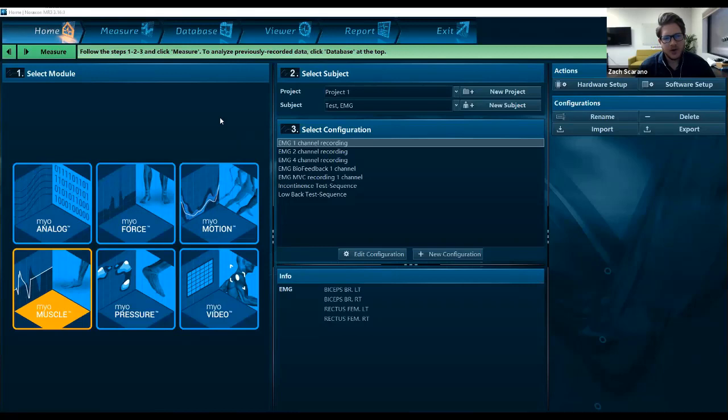And MR3 has a lot of different options to be able to use within the software for signal processing. That can include tools for applying to the time series data, or perhaps also in the analysis aspect by running reports and running different statistical options. For today's session, we are going to focus on applying the signal processing to the time series data and seeing how that can manipulate the signals that we're working with, which ultimately can be used in further analysis.